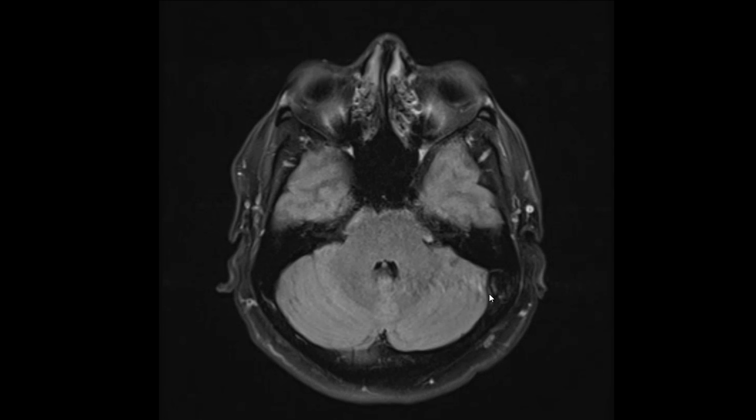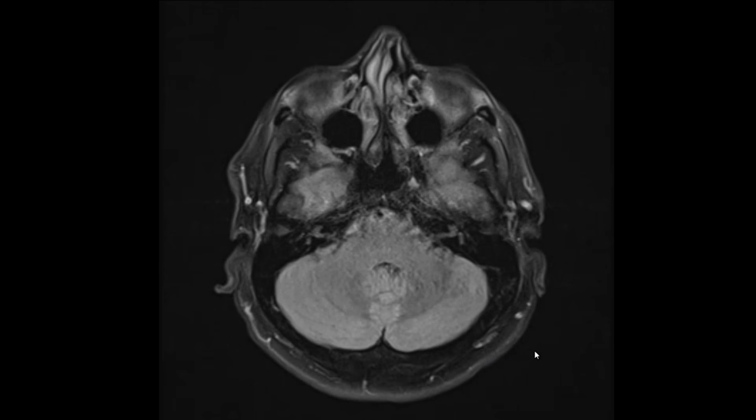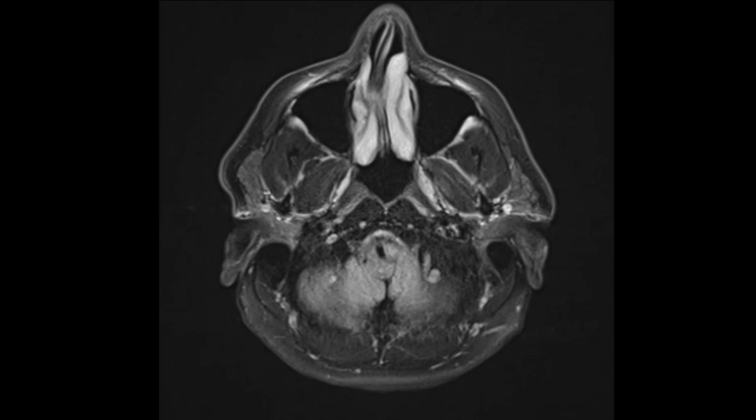Sometimes we may see slight FLAIR hyperintensity in transverse or sigmoid sinuses, which can be due to slow flow. Then we need to assess other sequences to find out a reason. Sometimes we can find a small ipsilateral jugular foramen. Sometimes we may not be able to explain it, and we may end up doing a CT or MR venogram to make sure we are not missing dural venous sinus thrombosis.